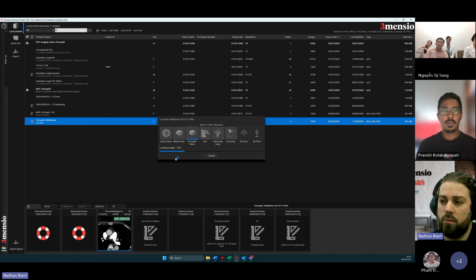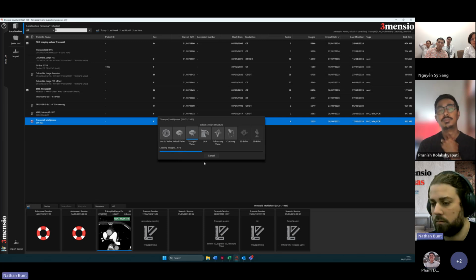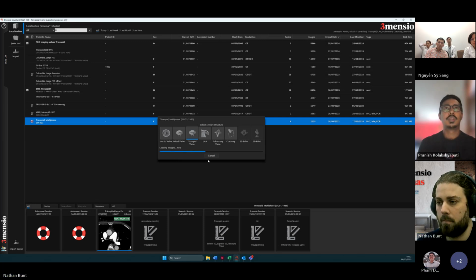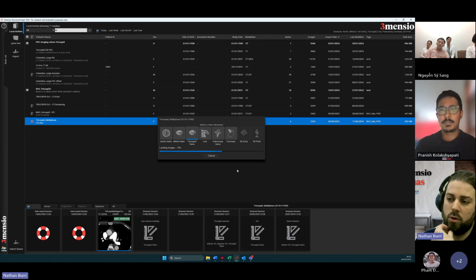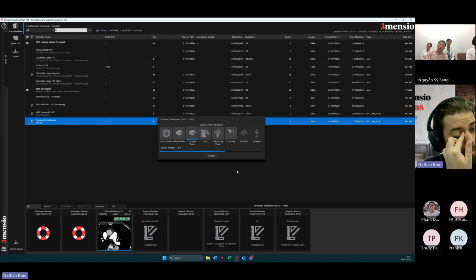And then I'm going to first show the main workflow functionalities, and then I'm going to skip to a different data set to show the IVC and SVC workflows as well. As we go, you'll also see that there will be a lot of similarities with the mitral workflow as well.